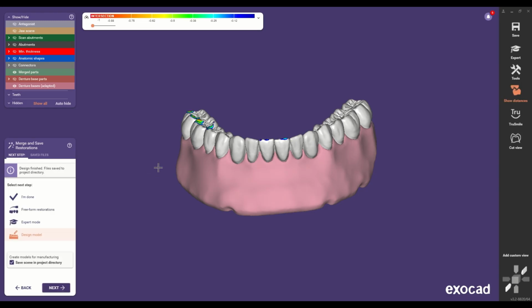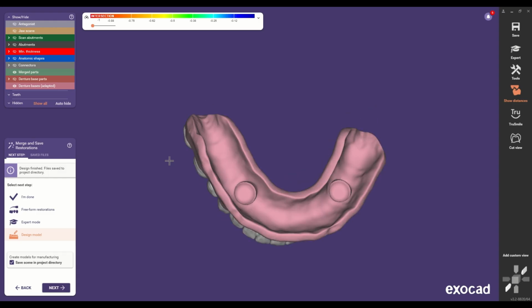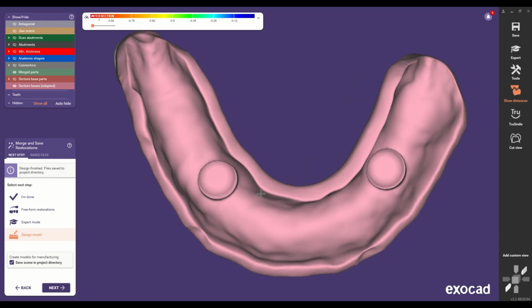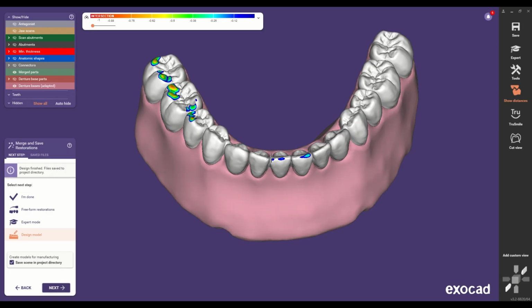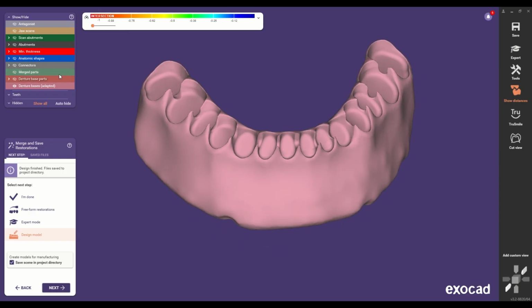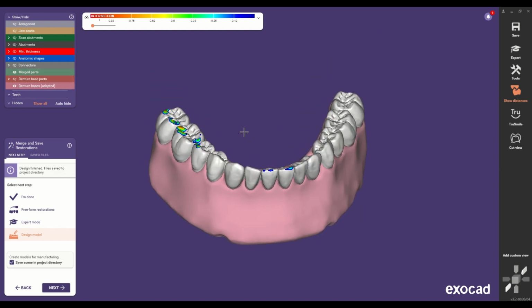At this point, you can place the PreatLoc abutments on the model and pick them up at the lab and send the denture with abutments in the model to the doctor. Or you can provide the doctor with the ideal cuff height indicated for each implant for them to acquire separately and send the denture without housings to have the doctor pick up the denture chairside instead. Simple. Please stay tuned as Preat will continue to evolve this tool in surprising ways that will further simplify the process to make and deliver PreatLoc digital dentures in a better, more efficient way.